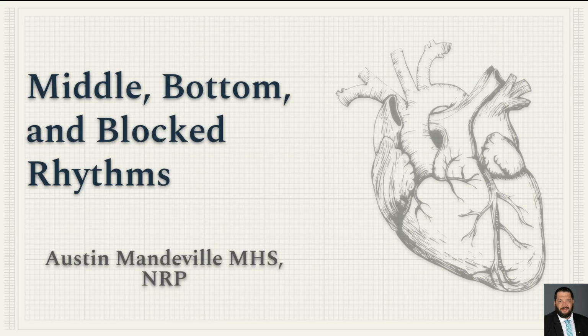Welcome back, everyone. For this lecture, we're going to discuss the remaining rhythms that we use on a 4-lead ECG for evaluation. Rhythms that originate in the middle of the heart, the AV junction, the bottom of the heart, the ventricles, as well as discuss some of the blocked rhythms.